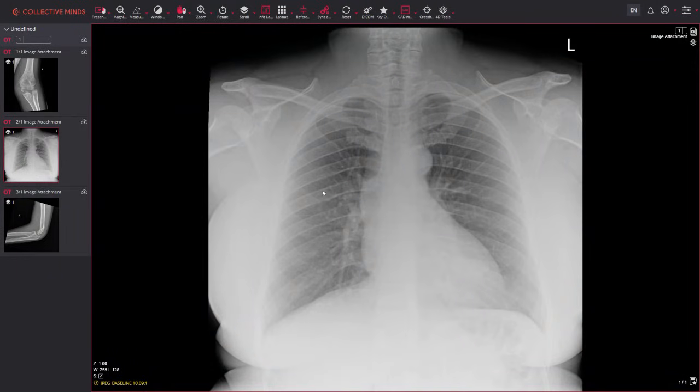In patients with asthma or COPD, you can get bronchial wall thickening as well, or something called bronchiectasis, where the bronchi become dilated. So you want to check for that. It'll look, again, quite busy, quite mesh-like. In patients with fibrosis, we would use the term reticular pattern. So that's a straw-like pattern where you have loads of white strands where you've got fibrous tissue in and amongst normal tissue, or areas where the air spaces have been damaged and you have cysts, cystic areas.